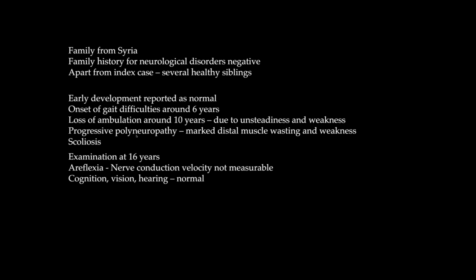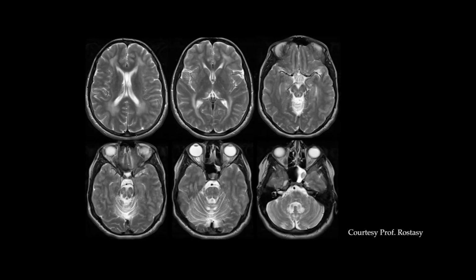Would you want to add anything, Argan? The clinical presentation? No, this was an electronic discussion. I have not seen the patient. Okay. So I'll move on to the MR images.